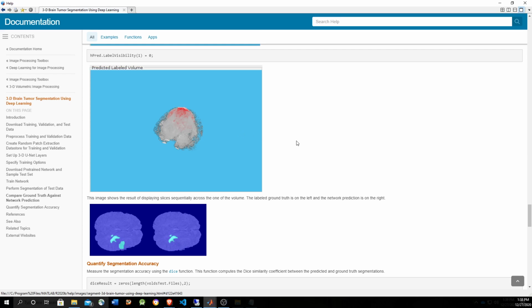After using the training data, we're going to test the neural network with test data, test images, and labels, which are totally independent from the training data, to verify that the network was trained, is able to generalize well and able to predict whether the brain has a tumor or not, for data that it has never seen before.